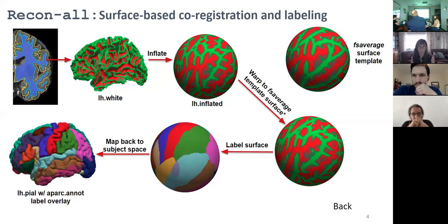If there's been a resection, I'm not sure what it would do. That kind of goes back to the lesion question from before. If you're just missing information here, there is no curvature. It's flat. What does it do?